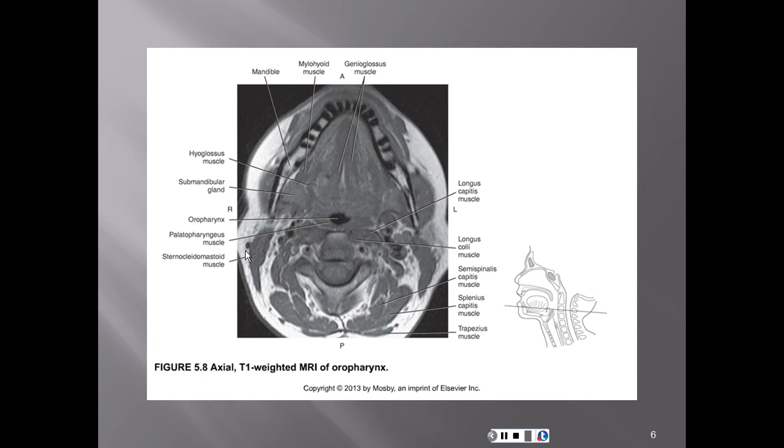mastoid. That's the mastoid portion. So one of its origins is on the mastoid. The other endpoint is on the sternum. It bifurcates at the end to the sternum, and the cleido is for the clavicle. So sternum and clavicle are the other endpoints for the sternocleidomastoid muscle. Very important muscle because it is a division point for certain anatomic structures of the neck. So that's what we want to pay particular attention to right now.